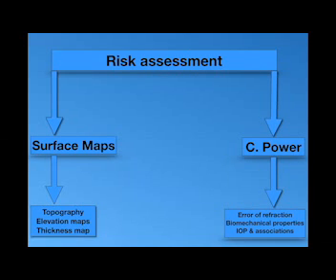The histology of the cornea may affect the corneal power and at the same time affect the images of the surface maps too. So the intraocular pressure is a very important factor to measure, to study, and to correlate with the central corneal thickness in the pachymetry map.